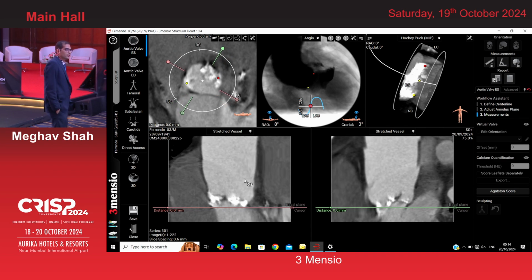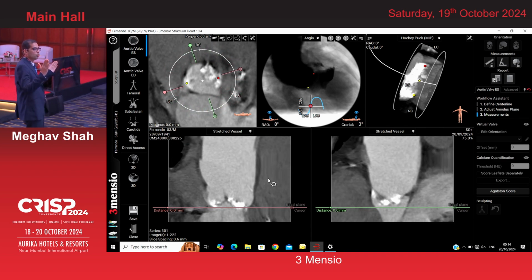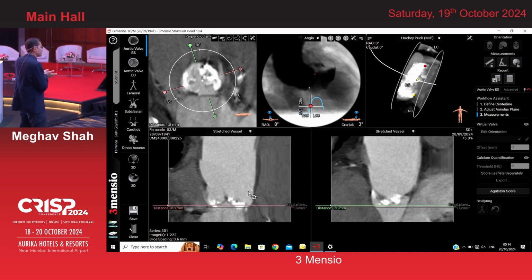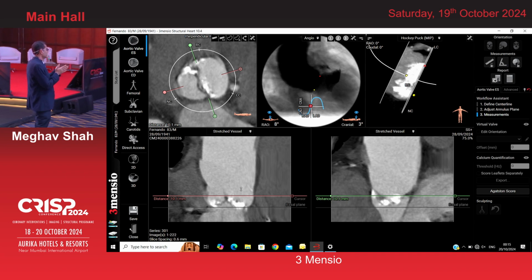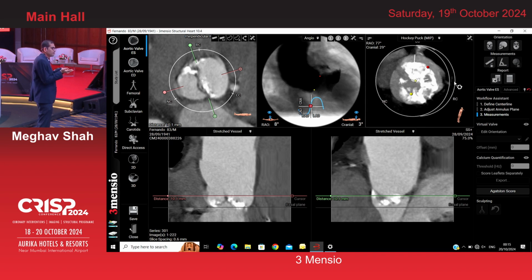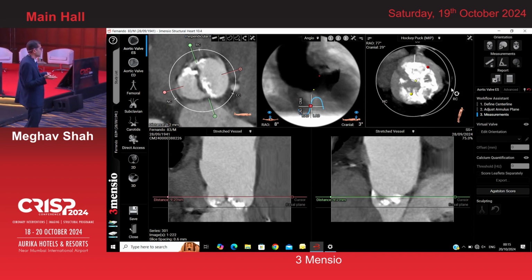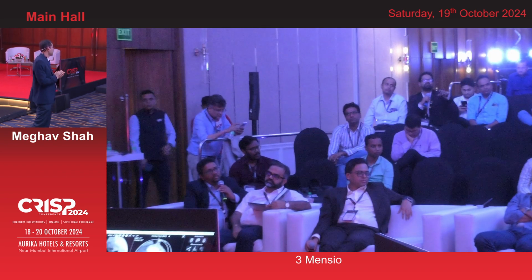Now, because bicuspids are calcific, they don't tend to open up completely. Depending on the morphology of the bicuspid valve, your sizing has to be less. So for balloon expanding, for tricuspid, you go for 10 to 15% oversize, but for many very severely calcific bicuspids, you go for 0% oversize also. A few times we have gone for -5% oversize as well.